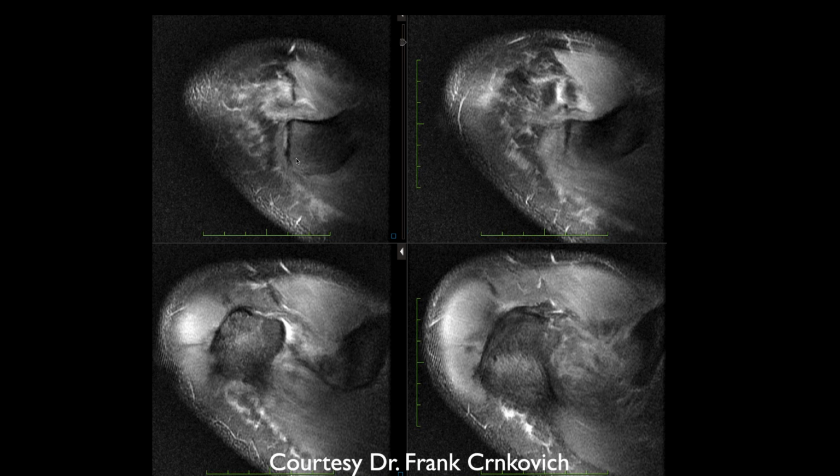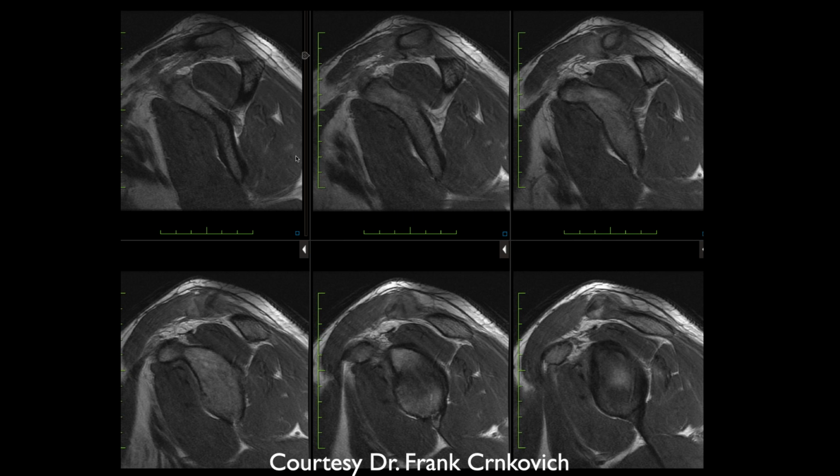Well, it's actually the acromion anteriorly displaced, but these are real severe injuries, and not just to the shoulder, but the whole body. You see the distal clavicle protruding into the overlying trapezius muscle, so it's dislocated into the muscle.